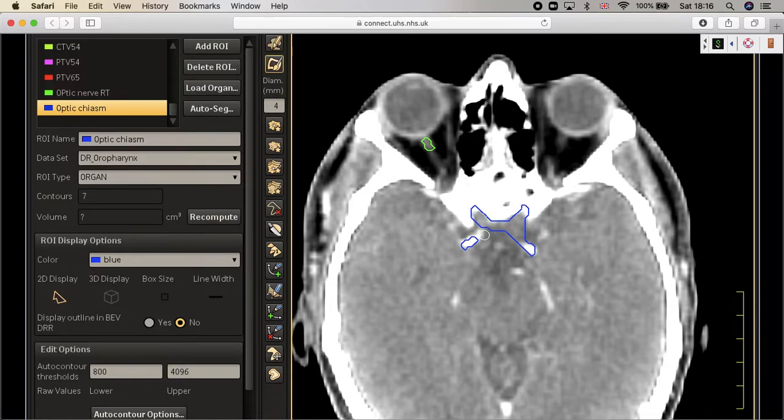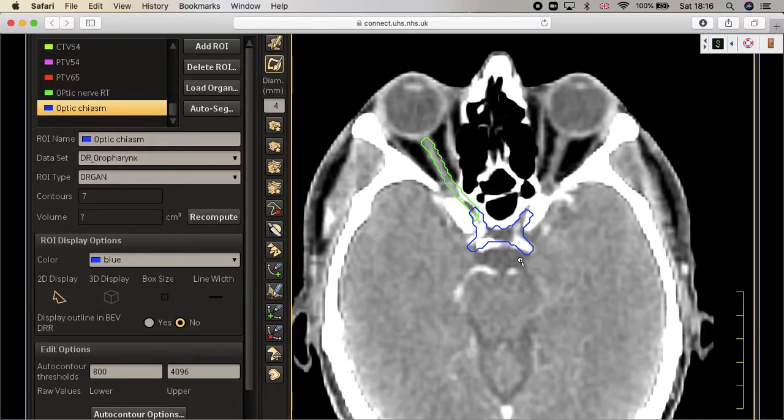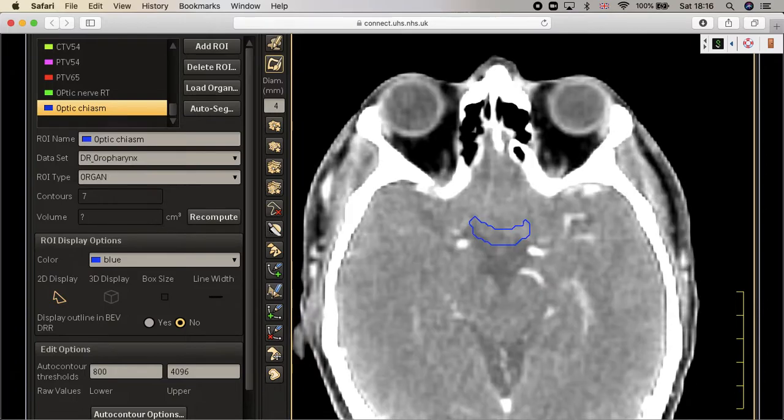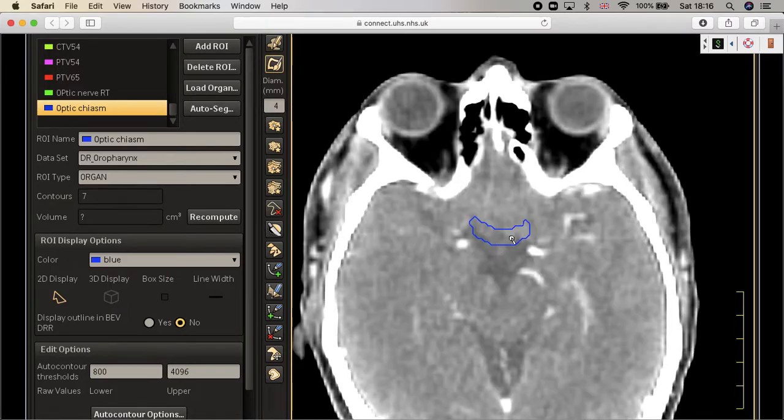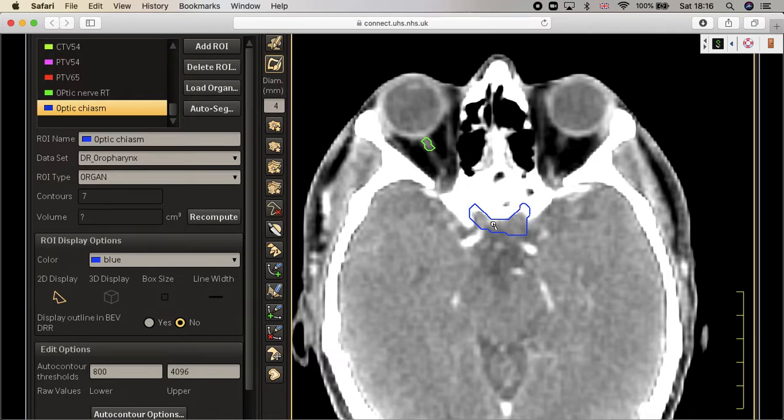And if you are not using contrast, it's easy to be mistaken, by the way. It will be very easy to say that this is the optic chiasm and I'm drawing it like that. So please don't make this mistake. This is the anterior cerebral artery. Remind yourself again and familiarize yourself again. Middle cerebral artery. Go down anterior to the infundibulum, anterior to the cursor, draw the first cut, another one to join the optic nerve.